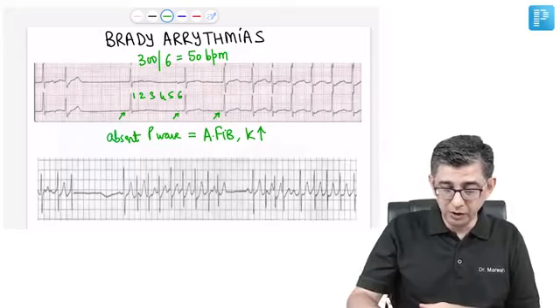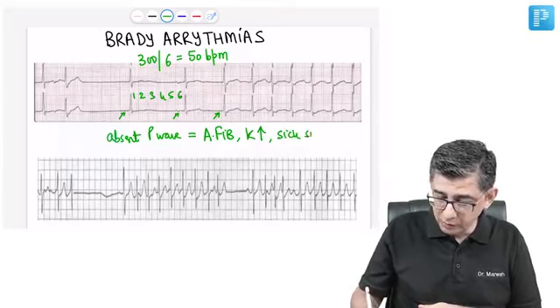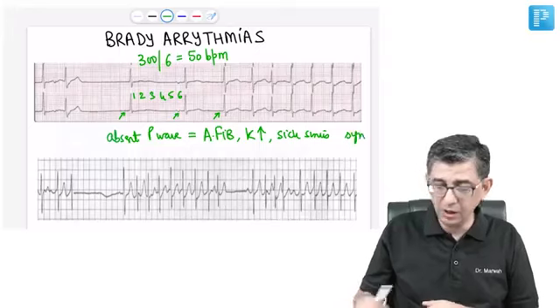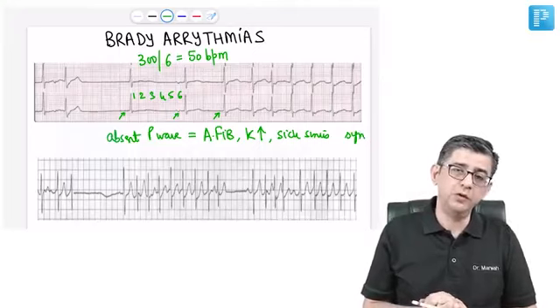So my interpretation in this case would be sick sinus syndrome. The problem of this patient is that the SA node is malfunctioning, and as a result the heart rate of this patient is only 50. Is this going to compromise the lifestyle of the patient?